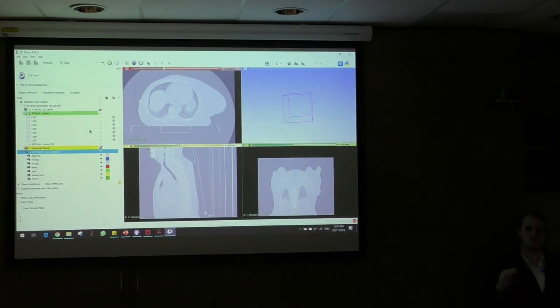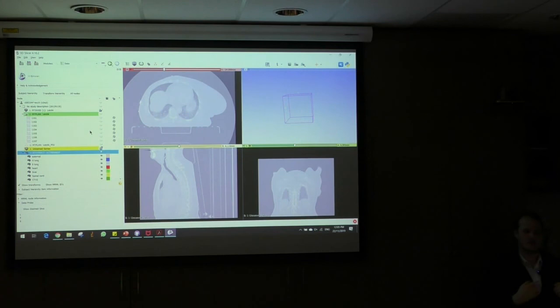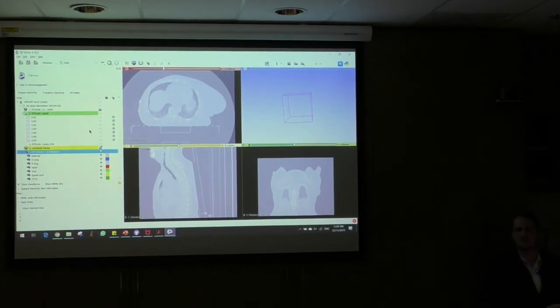One of the issues was that slice thickness that Siva was just talking about. The treatment planning software has a different slice thickness to the thickness that was defined in this software. So what I found was my model had actually slightly lost some information in between those layers. Again, it's just configuring the slicer to say this needs to match the slice thickness of your treatment planning software, and then it will line up accordingly. It was really cool doing that, actually, because I didn't think you could.